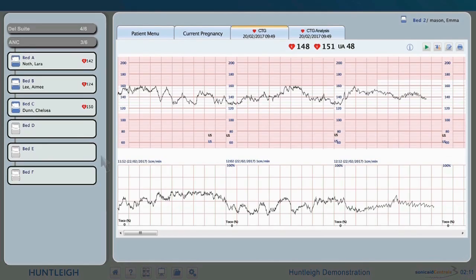point. If a large number of beds is shown on the left-hand bed frame, these can be compacted by clicking on the group to temporarily hide the beds. If any alert is activated, then the bed is highlighted in yellow, and an audible warning can be heard.